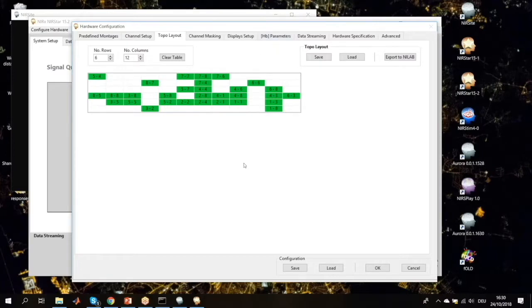If you feel that I'm going through NIRStar rather quickly, please look into our webinar where Thomas talked in detail how to set up NIRStar 15.2. I'm only going to go through the features which are related to short channels.